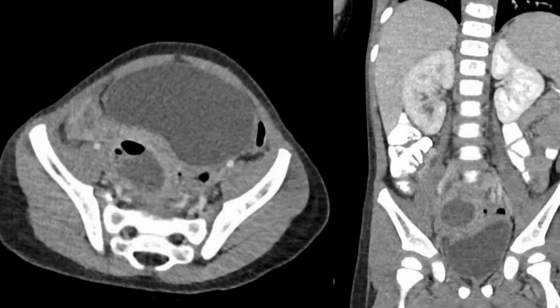If things get really bad, however, all bets are off. You might just see a mess of fluid and stranding in the right lower quadrant, with the appendix difficult or impossible to find since it's basically falling apart. An appendicolith in the middle of a large area of fluid and inflammation can be an excellent clue. Basically, a mess in the right lower quadrant in the absence of any normal appearing appendix should raise concern for ruptured appendicitis. Here's the case.